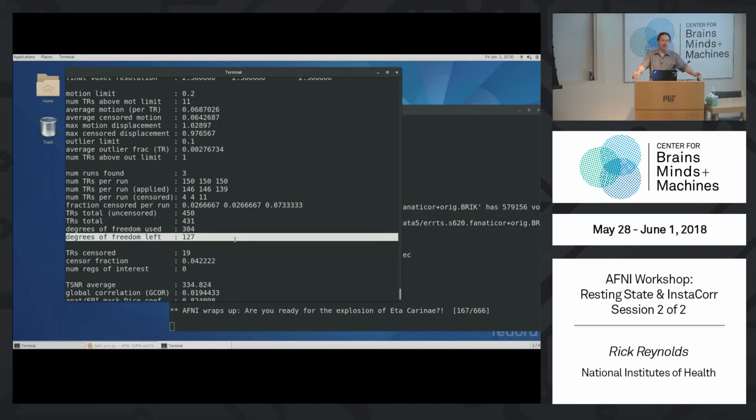Again, a lot of the big important papers on telling you how to analyze your data really were in the negatives here. I don't mean to be all doom and gloom, of course. You still get pretty pictures. I mean, you look at the stuff that we just ran with InstaCorr, fantastic. You get nice group results. But you just want to be careful so that you're not throwing away everything or putting your data in a bad place.